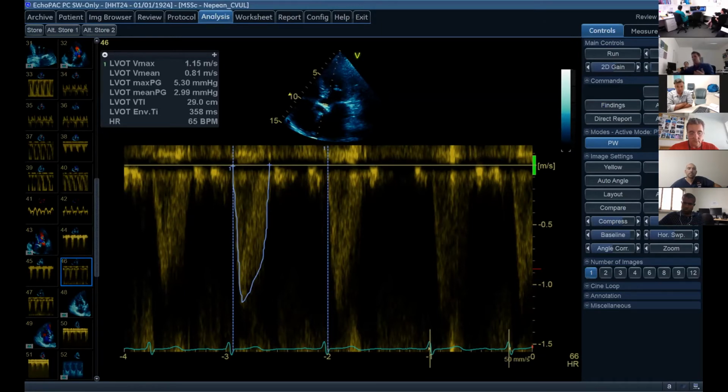And it's not traced very well either. Yeah, fair enough. I did a very good job anyway. No, fantastic. I don't think these are my pictures, I'll say that. I was just reporting the image. It wasn't me, Your Honor.